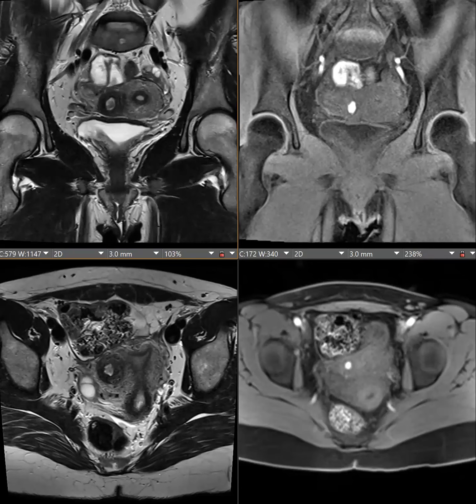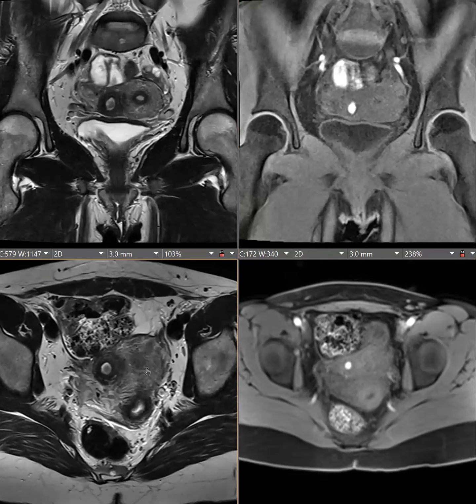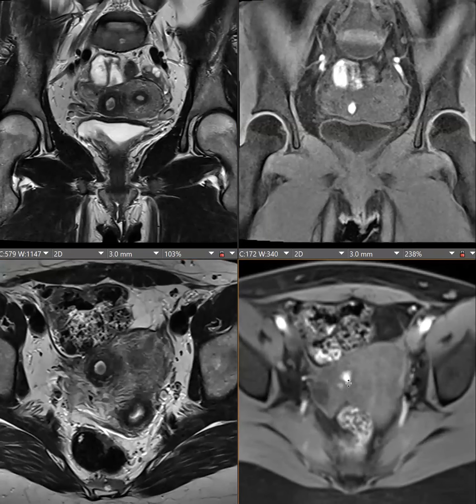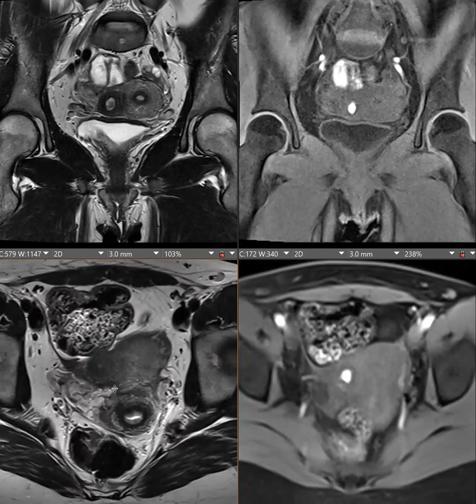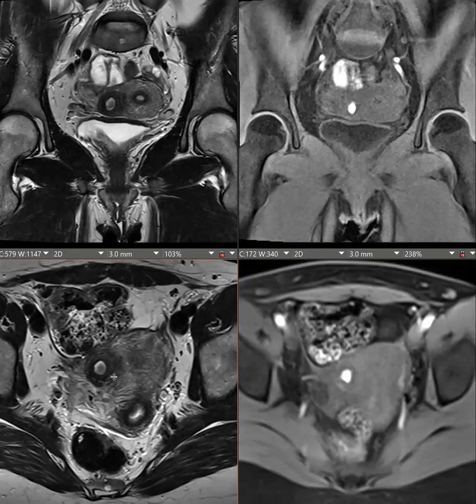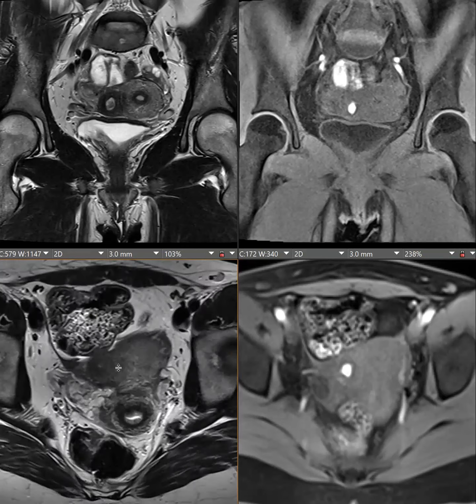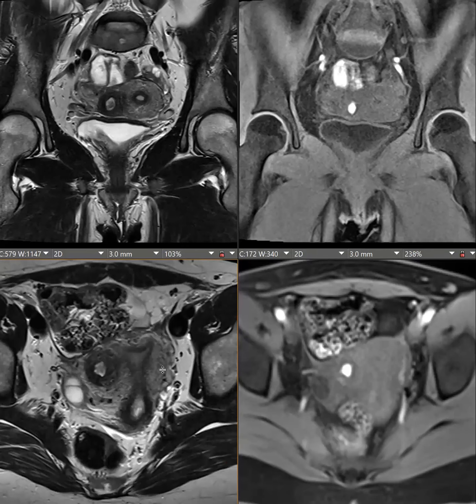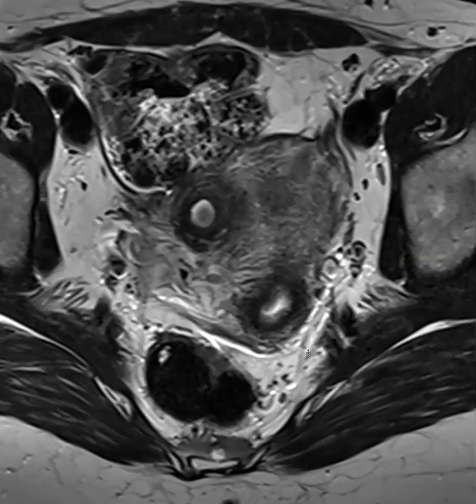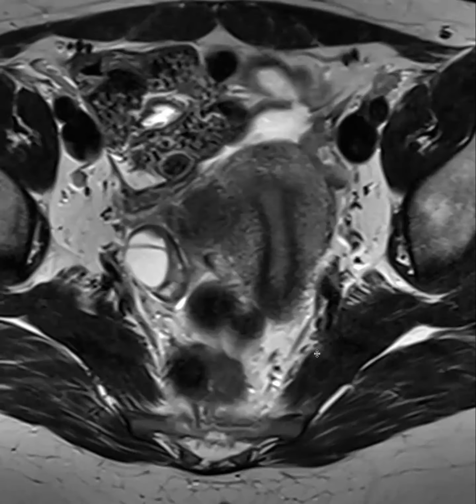Okay, HCG is negative. Could endometriosis look like that? It does have shading. It's T1 bright and then gets darker on T2. So there's blood. Good. I guess it's like a focal adenomyoma, but that is kind of separate from the endometrium.